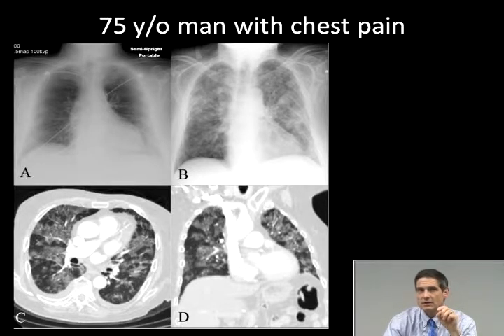And it wasn't really clear what was happening to this guy, because it's not representing one of the usual things that we just showed. It's not a tumor, it's not a pulmonary embolism, which I'll talk about in a little bit. It's not pneumothorax, there's no rib fracture, there's no mets here. What's going on?